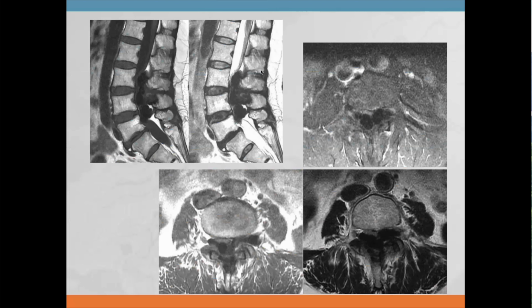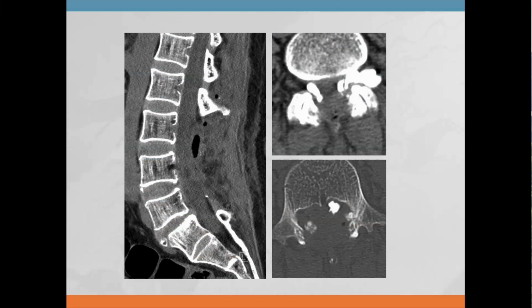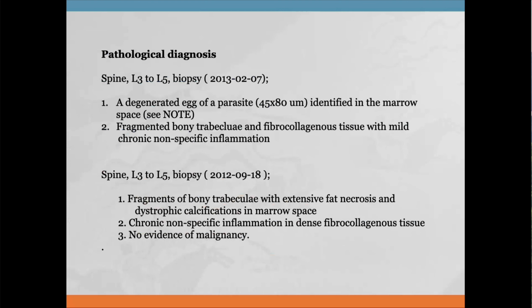And here we can see all these dystrophic calcifications in the soft tissues, producing central stenosis. So this was their differential diagnosis here. So they went in. What do you think here, Robert? All right, so it looks like they did some laminectomies. Yeah, to clean that out and get rid of the stenosis. So they did biopsy.